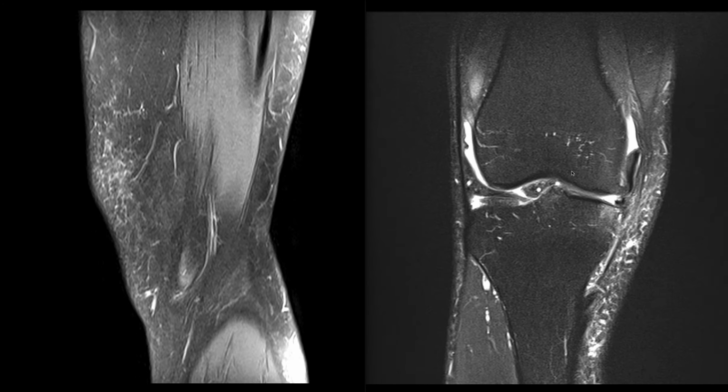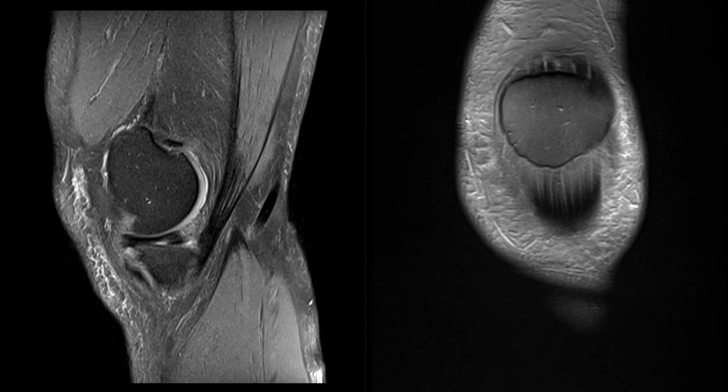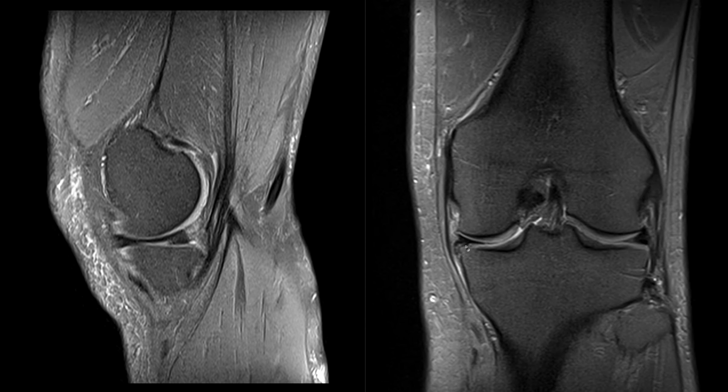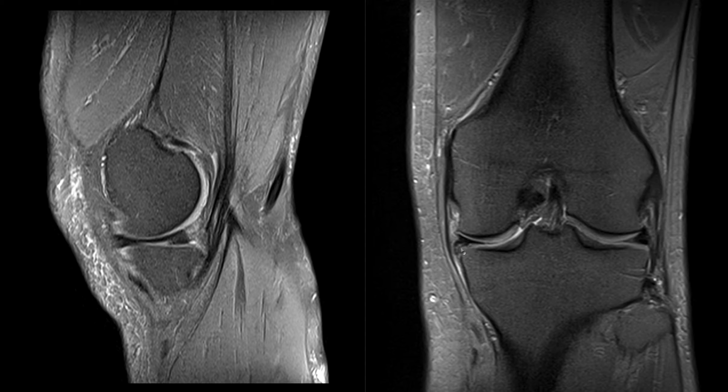Let's look at another patient. As we scan through the medial meniscus, once again we can see that there is an abnormality of the morphology of this meniscus. In this case, the body of the meniscus appears to be thinner. It's as though the lower part of the meniscal body is missing, and indeed that's exactly what it is. And in this case, we can see that the fragment has become displaced around the tibial rim into the medial recess. This is a very important lesion to find.